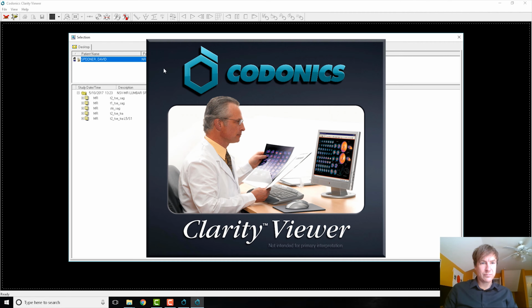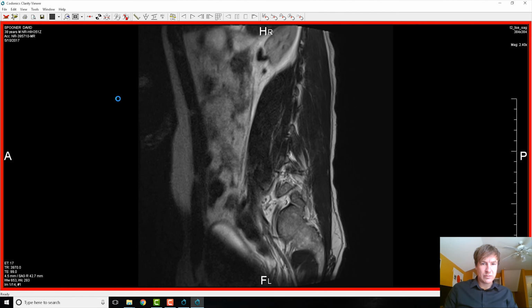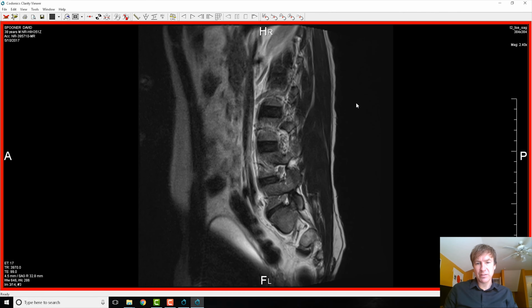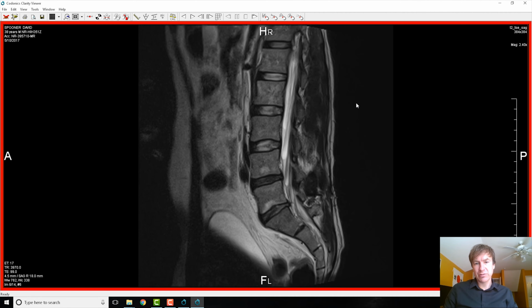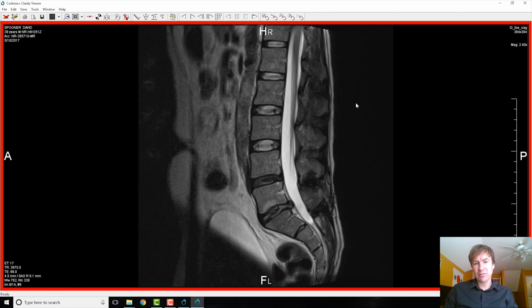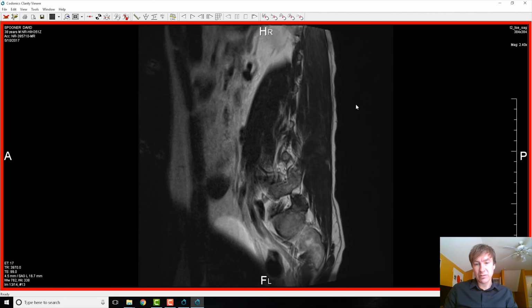All right, so here we go. Pulling this one up. All right, so this was the first one I had done in Australia, 3 or 4 days after I damaged my disc. And I didn't just damage it. This was the worst injury to my disc I've ever had. So I will kind of comment on this so you can see.